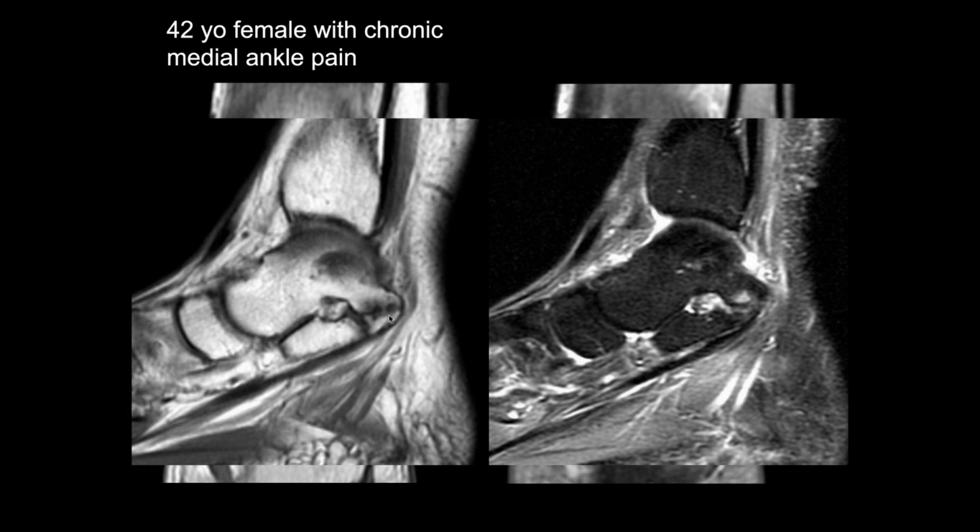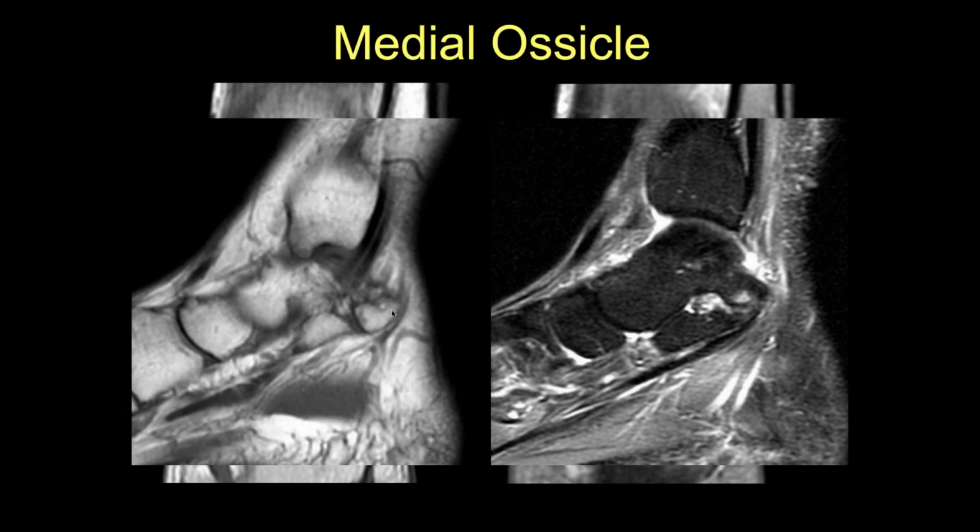So there could be old trauma, but it was probably congenital, producing a lot of degenerative disease associated with that posterior subtalar joint space. But just looking at this, my first thought would be that it would be a fibrous coalition. Mine too, but I would look for other pathology, or congenital pathology.